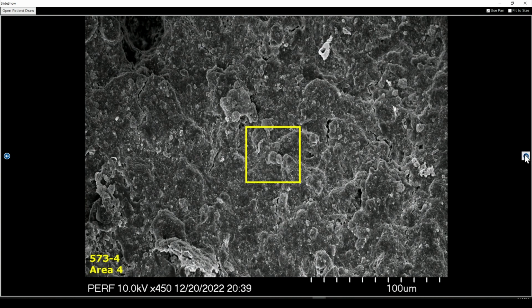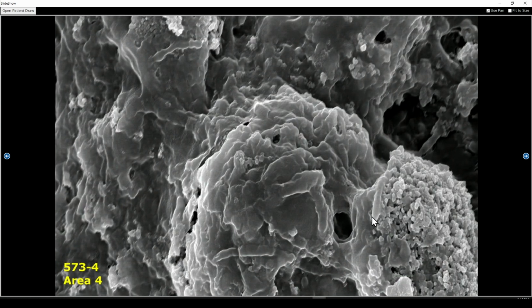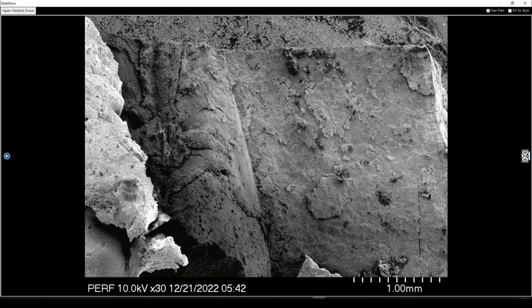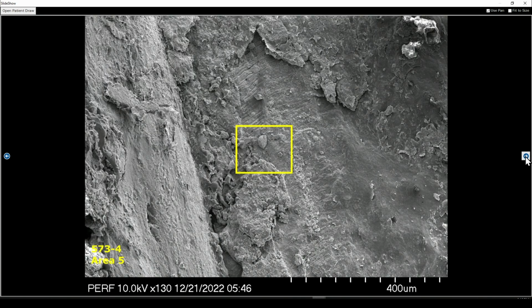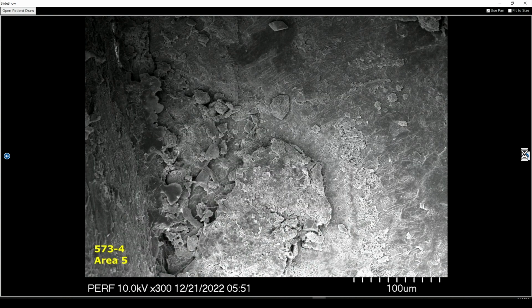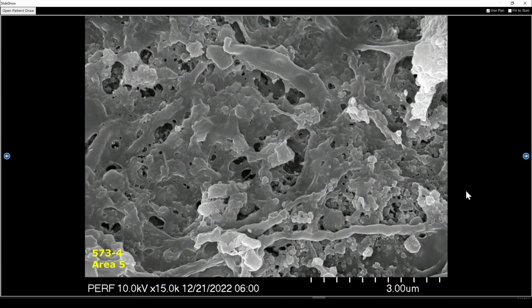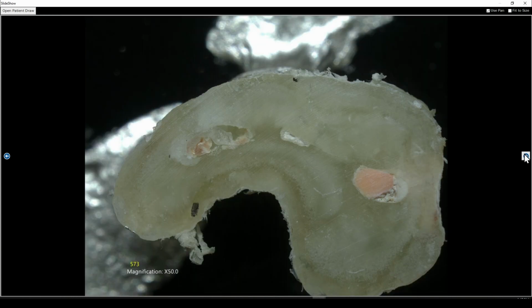I did not see any tissue within the canal at all, so it looks like the GentleWave did a pretty good job of removing the tissue. But encrusted on the canal wall was bacterial biofilm. There you can see the fracture plane. And you wouldn't expect the irrigation device to be able to remove any of that. Here's just another example of the EPS and how the biofilms present, so you can improve your pattern recognition.